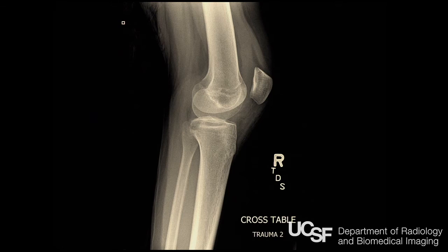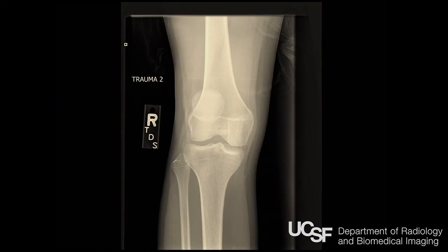In the setting of trauma, when I see a large joint effusion, even without a fat-fluid level, I'm looking very carefully to see if there's another fracture, and I'm more often than not inclined to talk to the clinician and ask them, maybe we should get a CT, see how they feel about it. Because a lot of times, if it's a big effusion in the setting of trauma, there's something else there that you're just not seeing. Maybe a hairline crack through the tibial plateau or through one of the femoral condyles, or an impaction injury.